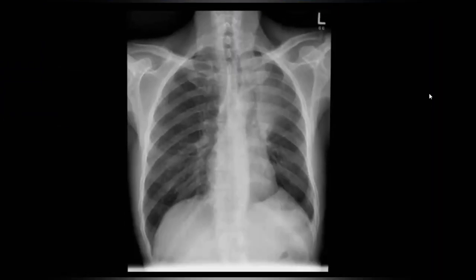Okay, this is the chest radiograph, frontal projection, provided to me. I can appreciate that the left hemithorax shows a veil-like opacity in the left upper zone, and there's also tenting of the diaphragm, and there is lucency adjacent to the aortic knuckle, and there is also deviation of the trachea towards the left side. Considering these features, there is most likely left upper lobe collapse in this region.